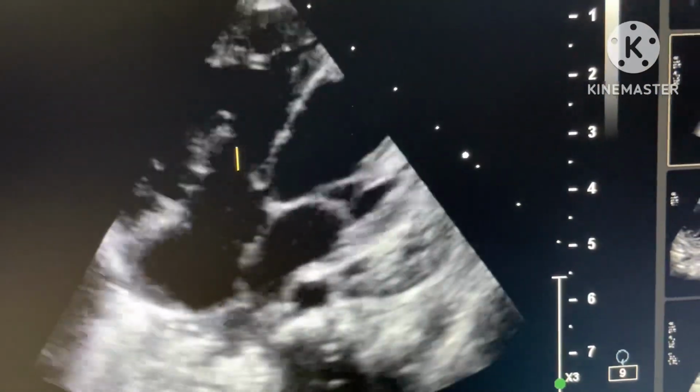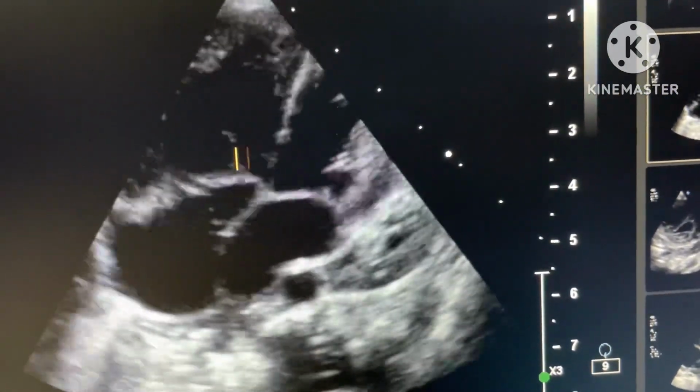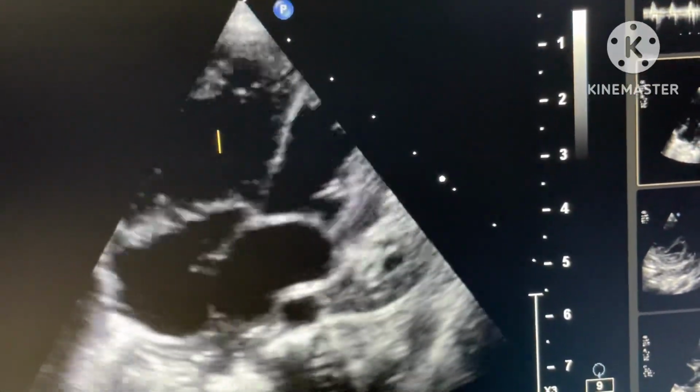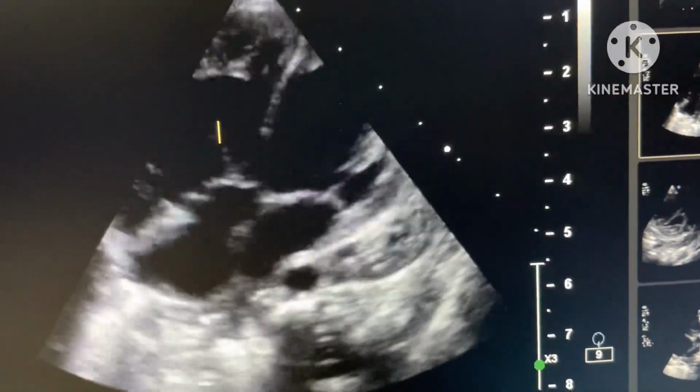This image shows some sort of abnormality on the right side. Our right side pressure has to be increased at the same time. Next image will show you all these findings.